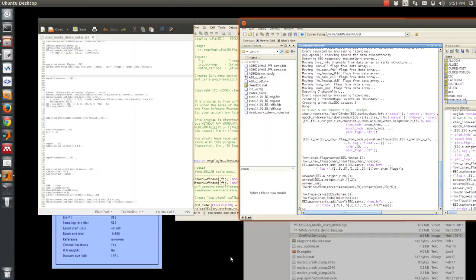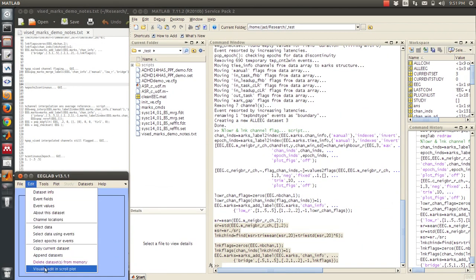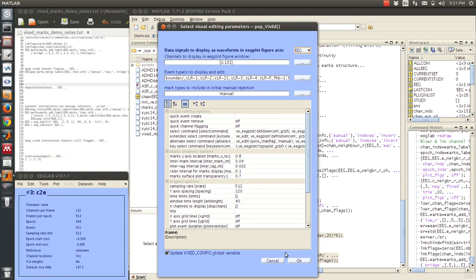Okay, now that's done, and we just have to go to the marks, and then we'll plot it the exact same way. Now, actually, because we're looking at channels at this point, I'm just going to change a property of the time marks. This is the transparency of them, so I'm going to drop this down to 0.3, and then we'll be able to see the channel flags a bit easier.